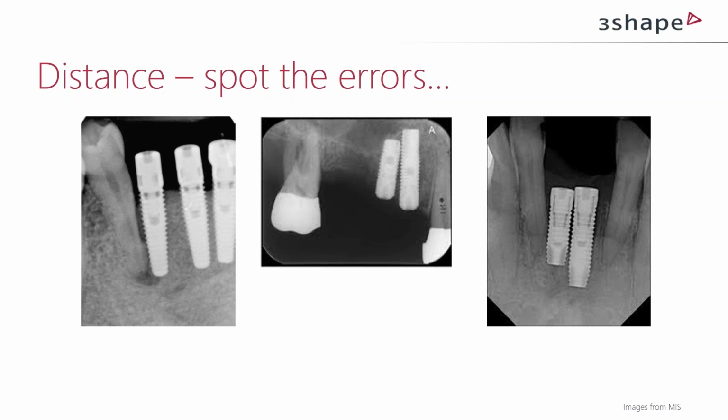Good point. Here I want to show you some errors that can easily occur, and maybe you guess already, but this is not done with any planning tool or with a surgical guide. This webinar is a part of the Inside Implant Studio series. So of course normally we talk about planned surgery and guided surgery, but this is what can happen even if you are skilled.